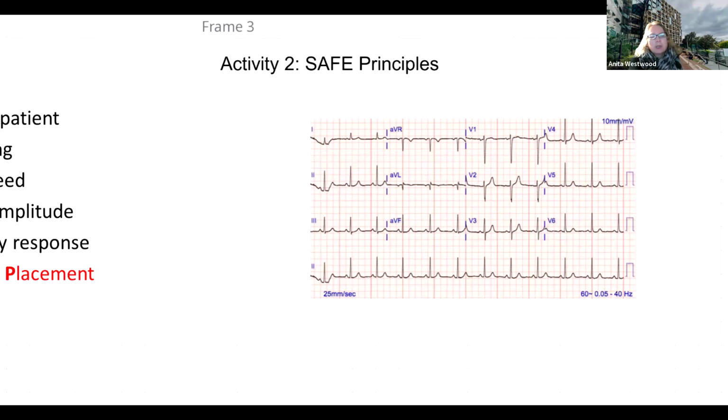So sometimes you can also check by looking at the limb leads, and as you've already said, Kate, lead 1 and V6 are lateral leads, so they're going to have a similar perspective there, or view, I should say.